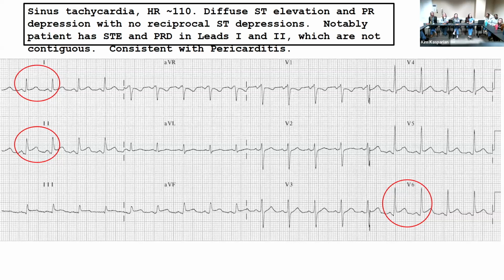I have seen a lot of patients with pericarditis. I've never seen one that had the classic EKG findings. So these are not all that sensitive or specific, but they're neat.